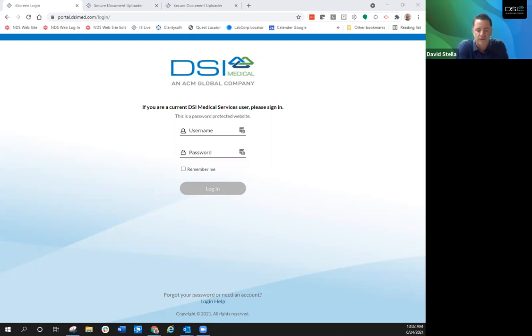If you currently send your applicant or employee to a collection site with a paper chain of custody form, this is the area where you will obtain your results. We feel strongly you'll really like the features.